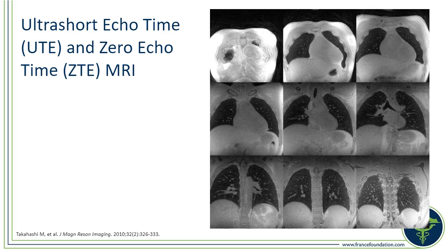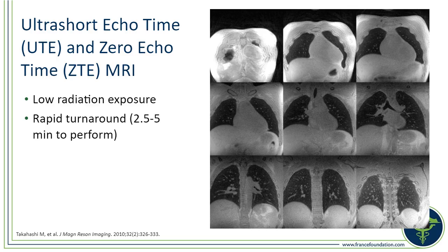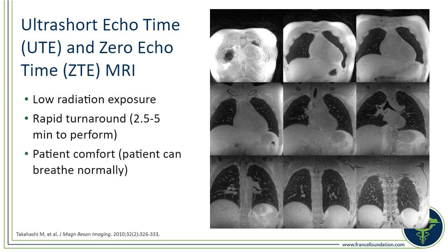This tool is remarkable in that it's an MRI image, so it has no radiation, and instead of the typical longer period of time, it takes only 2.5 minutes. The patient has respiratory gating, so the exam is only imaged while the patient is breathing in, so there's less motion artifact. And the image quality is excellent on this healthy person. Of course, it's going to be more challenging when someone is short of breath, but it's going in the right direction with its no radiation, short time, and respiratory gating.